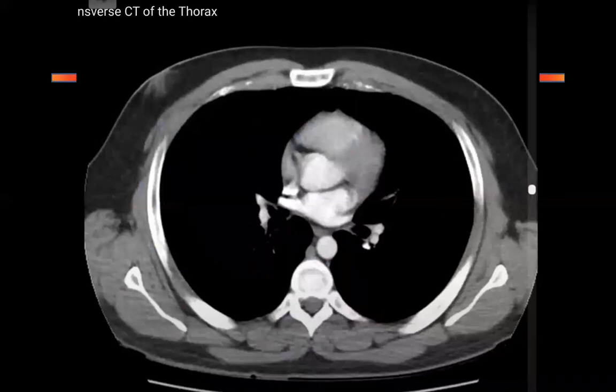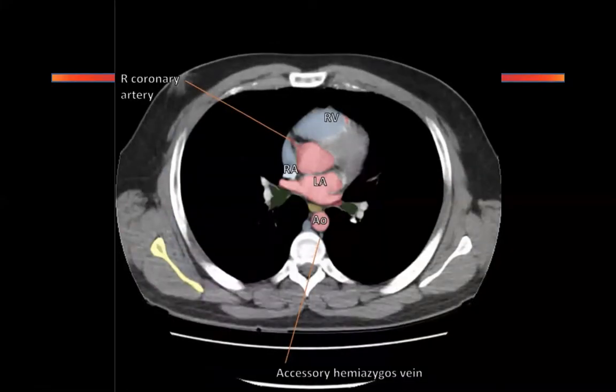Okay, we have gone slightly higher now. Can you see the right and the left bronchus coming into view? Look for the right and the left bronchus coming into view. The green bits.